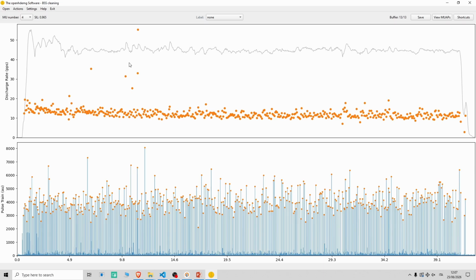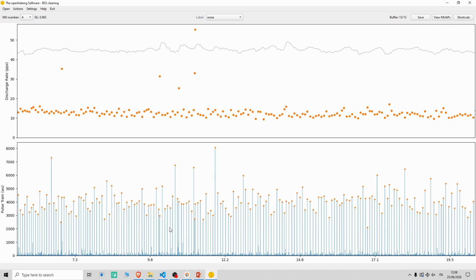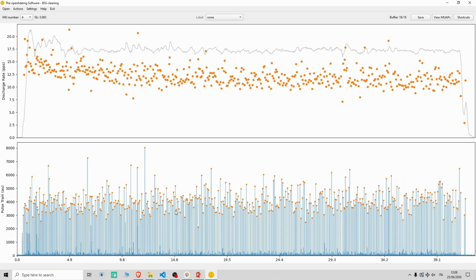In addition to that, we look at the coherence that we have between the discharge pattern, the frequency, and the force profile. So, for example, here the force is very stable, while the frequency is extremely variable. When this happens, at least in healthy participants, we can assume that there has been some errors and problems in the detection of the discharge times. So we can proceed with the manual editing and try to optimize the discharge pattern that we see. Now, I'm not doing it in the best possible way, probably, but again, we won't have time to go too much into detail.